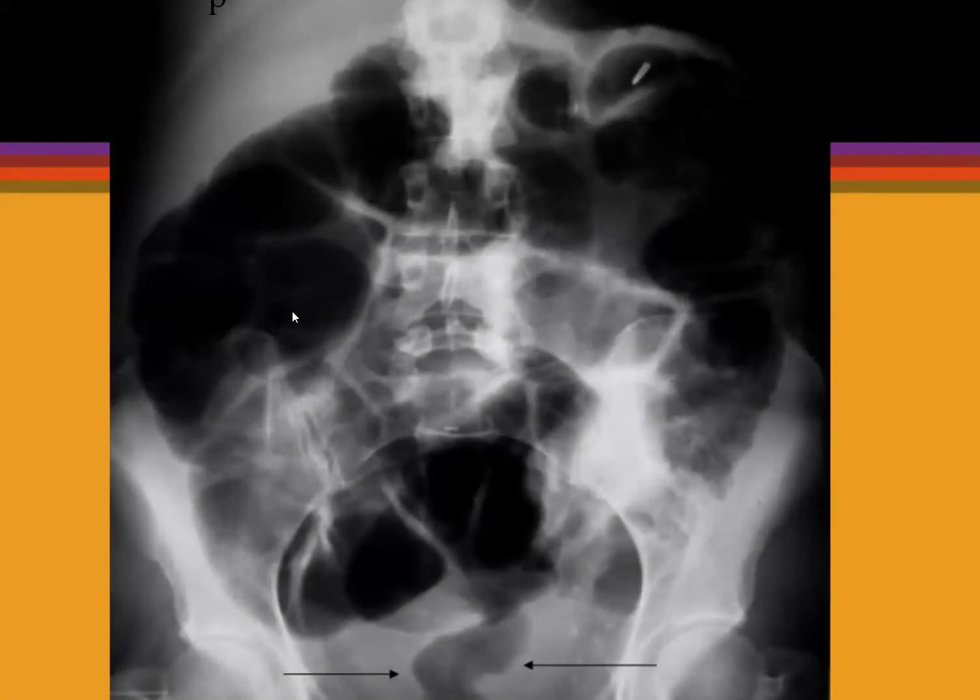Another really nice example of large bowel obstruction is the cecum here, really widened, about to perforate, I suspect. There's a little bit of small bowel. So this is rectum here, so air in the rectum, but this isn't dilated, so there must be something going on within the sigmoid colon, because the bowel proximal to the sigmoid colon is dilated, but distal to it is collapsed. So there's probably a sigmoid tumor there, or a stricture.